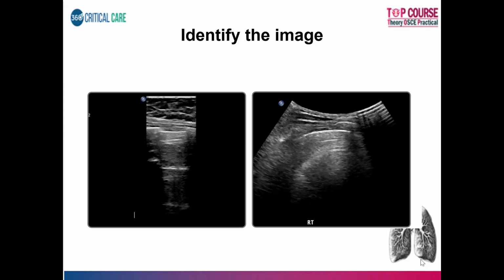Okay, but yeah, see a few things you can see. There is no B lines which is seen. There is the presence of the pleural shadow which is there. Okay, the pleural line is hyperechoic and it is uniform throughout. Okay, so since it's a static image, you can tell those 2 points along with the presence of A profile. Okay, so that's all we can tell. If they give you a dynamic image, then you can tell lung slide. Okay, here we cannot comment on sliding because you're not seeing a dynamic image.